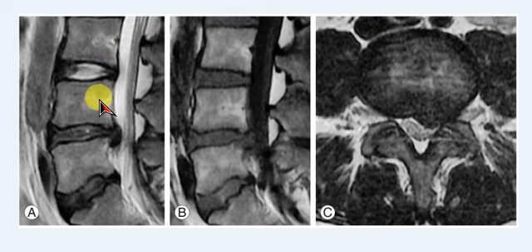This is a vertebral body, this is a vertebral body, and this is a vertebral body, and in between the vertebral bodies we can see the intervertebral disc. This disc is hydrated, so it is white, and this is a bit less hydrated, so it is less bright and white, and similarly this is more dehydrated, so it appears black. But there is a slight difference.